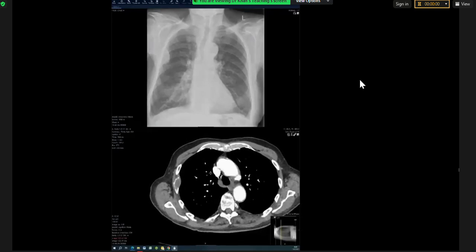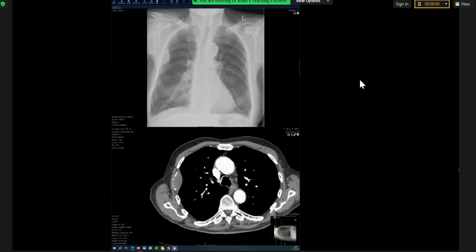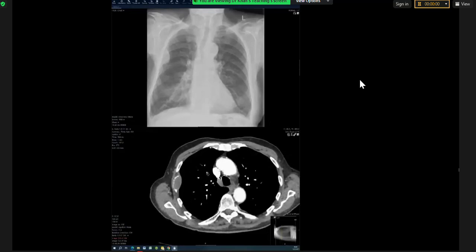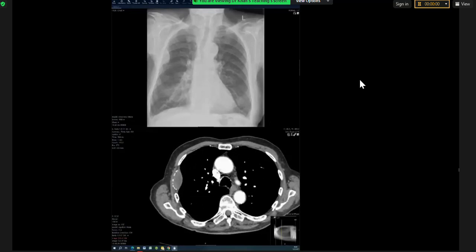It also has some peripheral areas of calcification, but I think that's residual rib. I would look at the other bony structures to see if there's any further lesions. Particularly, I would interrogate the spine to exclude any spinal compression or pathological fractures.